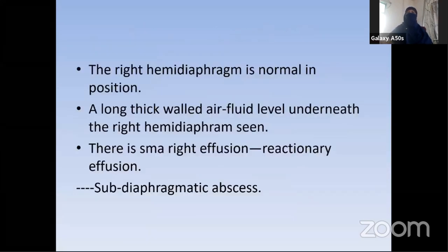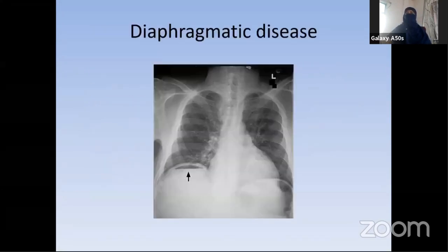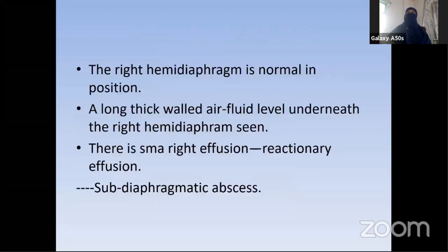Next, we are describing the slide above that we have seen here. The right hemidiaphragm is normal in position. A long, thick-walled air fluid level underneath the right hemidiaphragm is seen. There is a small right effusion, that is a reactionary effusion, and the diagnosis is subdiaphragmatic abscess.